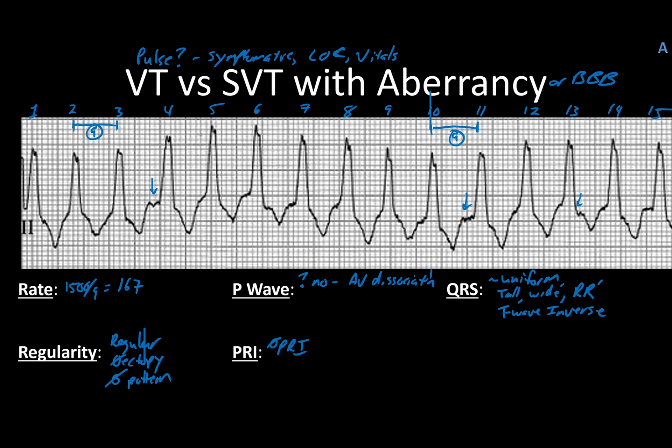And if I go ahead and try and get a measurement on these, I like this one here because it's right near the start of a big line. I could probably go over a little bit. And I'm going to say that this is my J point here. So I've got 1, 2, right at about 3, which really doesn't help me at all either. Which is essentially normal, but also on the borderline of being either a bundle branch block or a wide QRS.